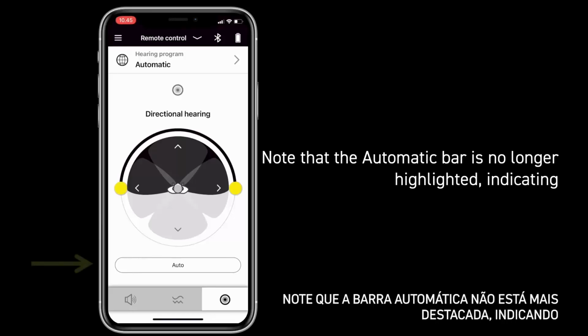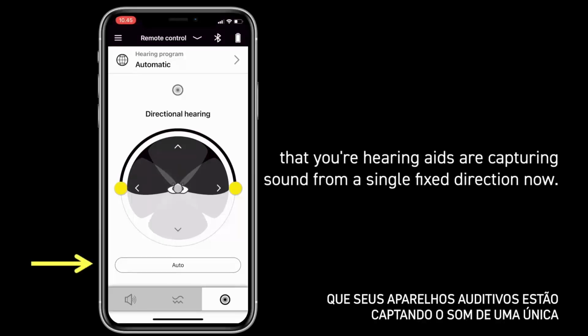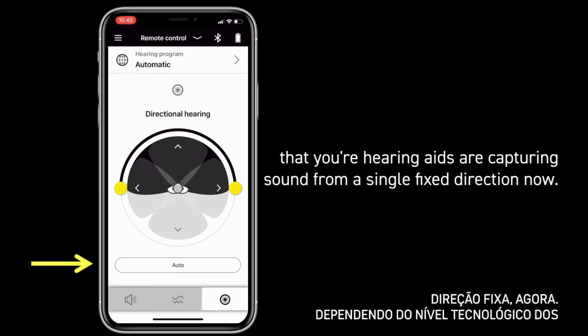Note that the automatic bar is no longer highlighted, indicating that your hearing aids are capturing sound from a single fixed direction now.